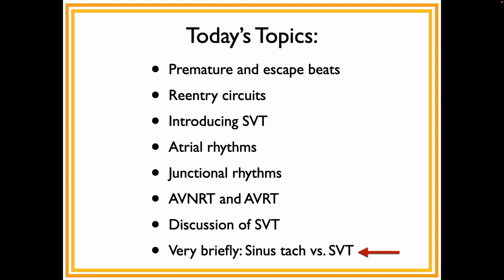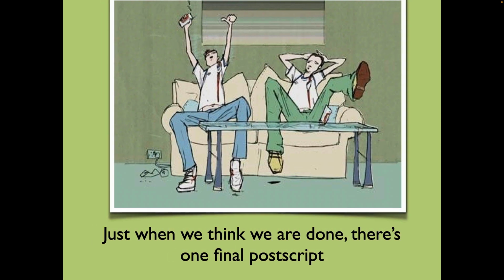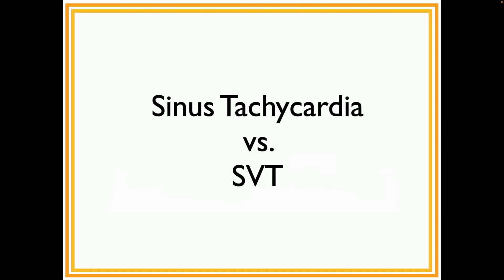So there's just a little bit of a postscript on the atrial junctional lecture, which I like to do after we've done all the practice so it doesn't confuse things. What I'm going to talk about is sinus tach versus SVT. Just when you think you're done, what we've got is sinus tach versus, again, PSVT, our definition of SVT.